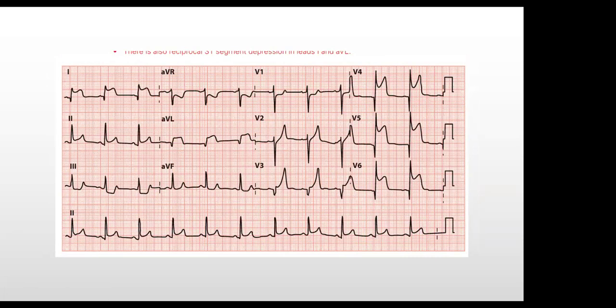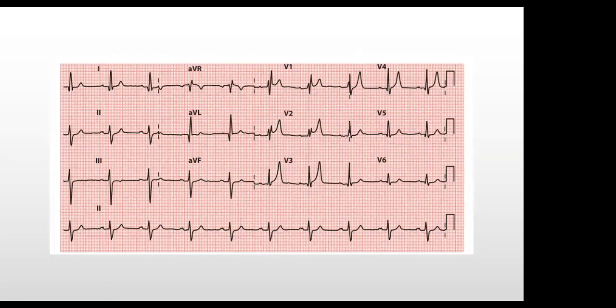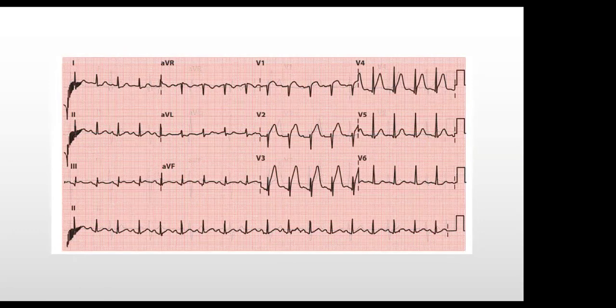Okay, I think this one we've seen. So this is more of an anterior MI with inferior changes. We've seen something like this before. The one before we said anterior. Yeah, we've seen this before. I think we've seen this also.